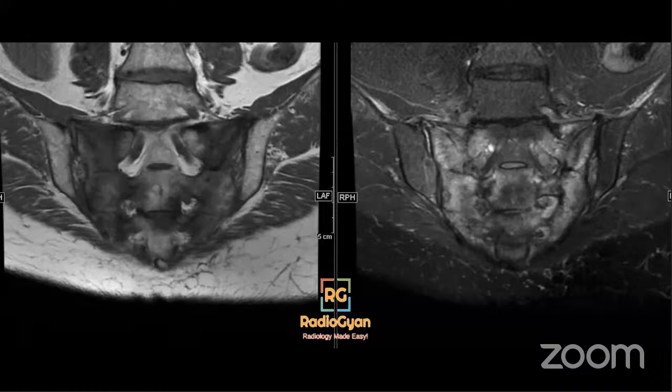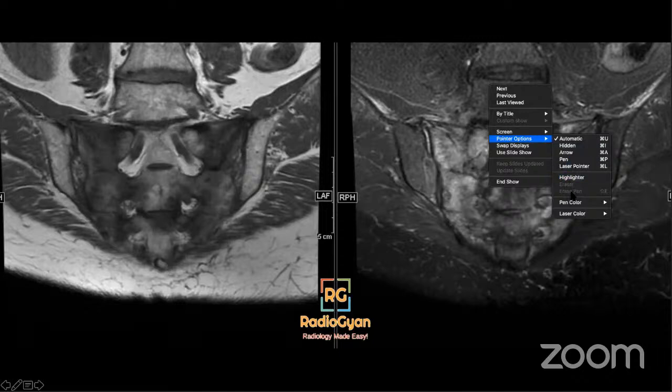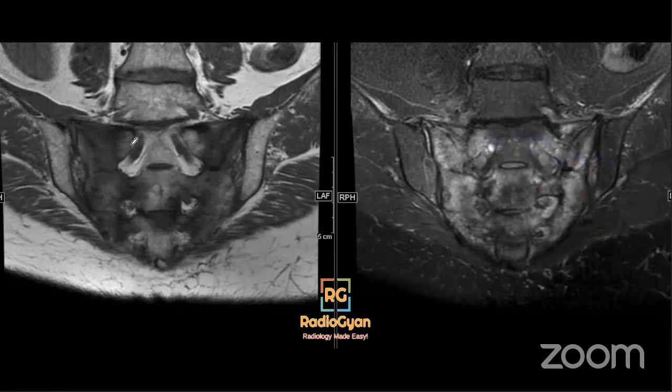So on bone scan, the appearance has been described as the Honda sign. So I'll try to just get my pen here. The appearance simulates that of the automobile manufacturer Honda, their logo. It's not a very sensitive sign. You see it in 20 to 40%, but it's a very specific sign.